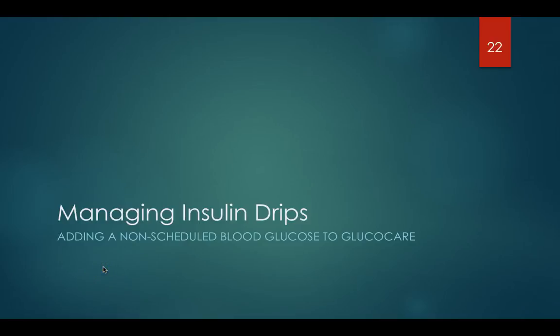Okay, so in the last video, what we went over was alerts, and we also went over how to add a scheduled blood glucose check to GlucoCare. It just happened to occur right while we were filming the video, so we got to see the different banners and how the color changes. Now I'm going to show you how to add a non-scheduled blood glucose check to GlucoCare.